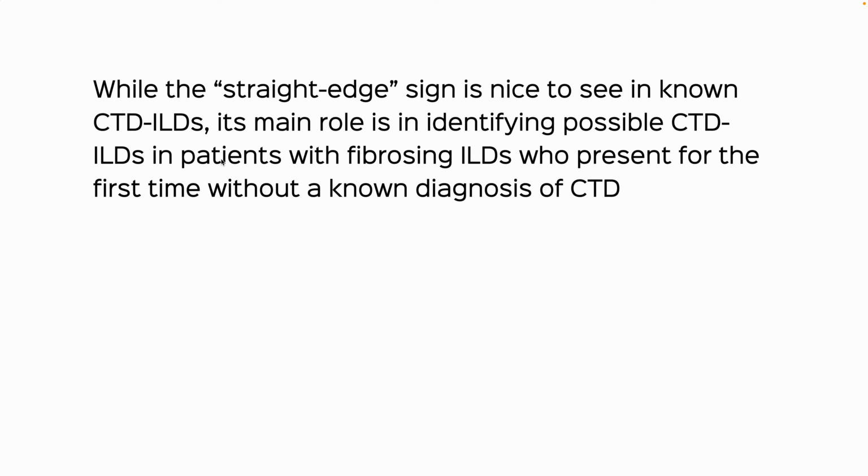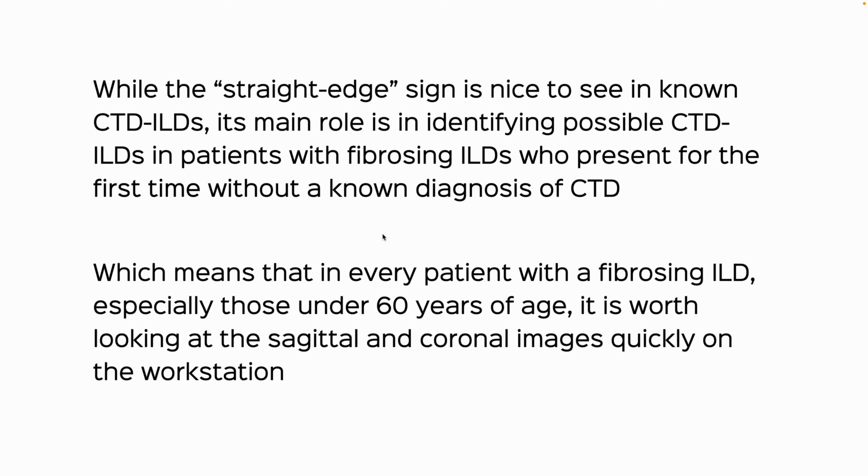While this is nice to know in CTD-ILDs, it's not going to add anything more in a known CTD-ILD. Its role is in identifying possible CTD-ILD in patients who present for the first time with a fibrosing ILD without a known diagnosis of connective tissue disease.